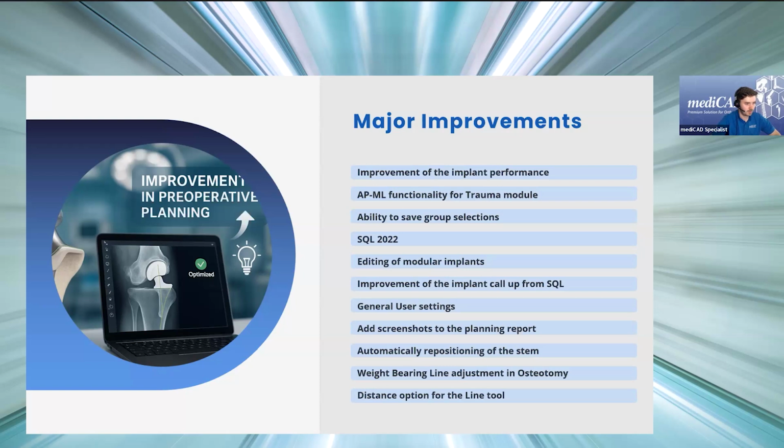Maybe just to look a little bit ahead, what I'm going to do now, I will go through 3 modules, mainly the main ones, with hip, knee, and osteotomy. We will go a little bit more quickly through it. The main point is obviously to cover the new functionalities, and it will probably take around 30 to 45 minutes. I try to keep it in the time so that if there are any questions after that, we also have enough time to answer those.